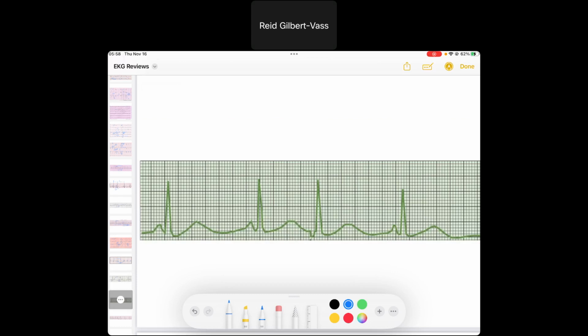Okay. So here we've got narrow QRSs that are kind of ticking away, and then maybe a quick tick here, and then ticking away. They look a little better, and so maybe this is a premature beat of some sort. Normal beats have P waves, normal PR interval. This one is very interesting. We've got this funky beat, but I don't see a P wave. You might ask, what is this little pimple looking deflection there?